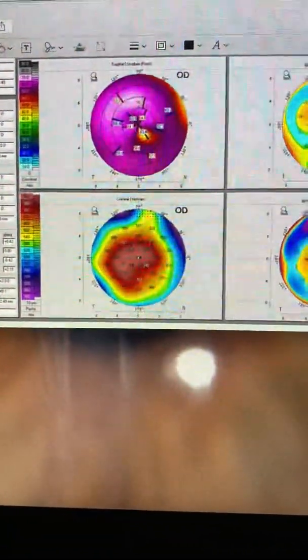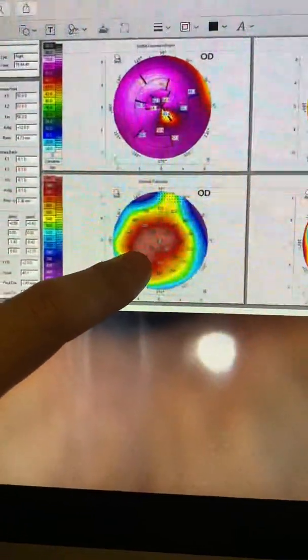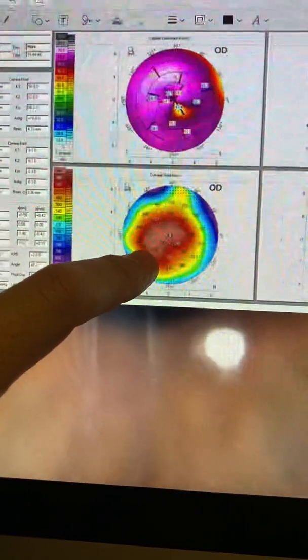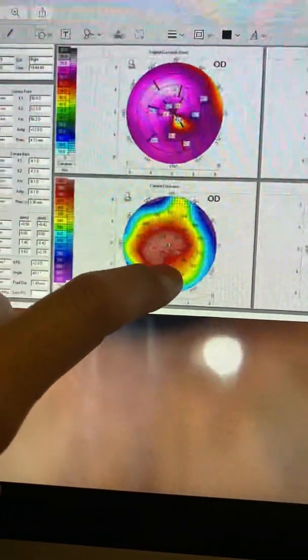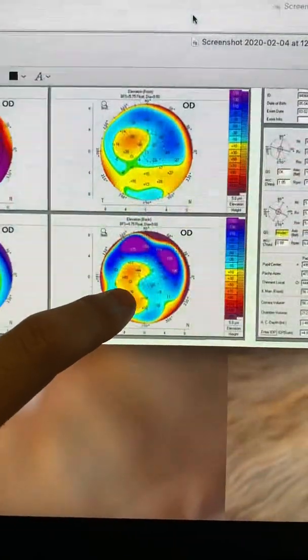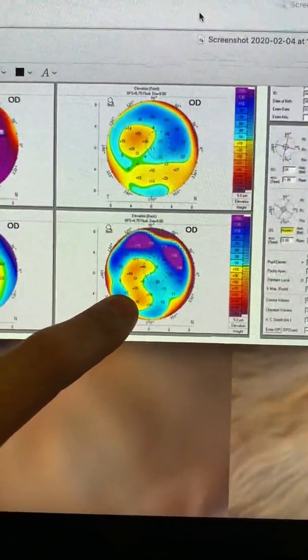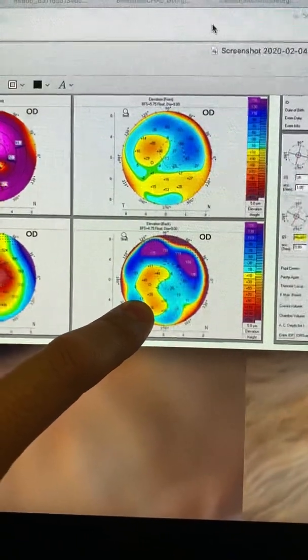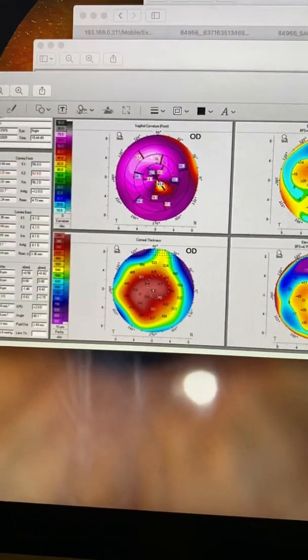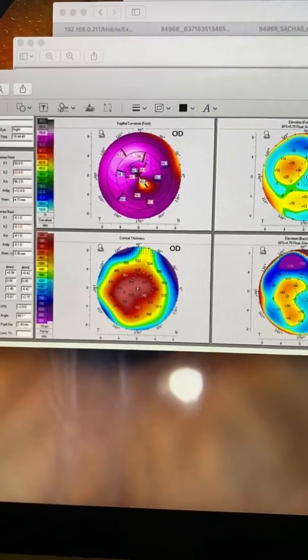Let's go back and look at the Pentacam maps. On Pentacam, we can see that the right eye has significant thinning. Note where the thinning is on Pentacam on that right eye. Remember, the split in Descemet's is central, if not slightly nasal. And you can see that the posterior corneal curvature also depicts the classic position for a cone, and temporally, anterior curvature, and the very advanced keratoconus in that eye, thus the fitting with PROSE lens.